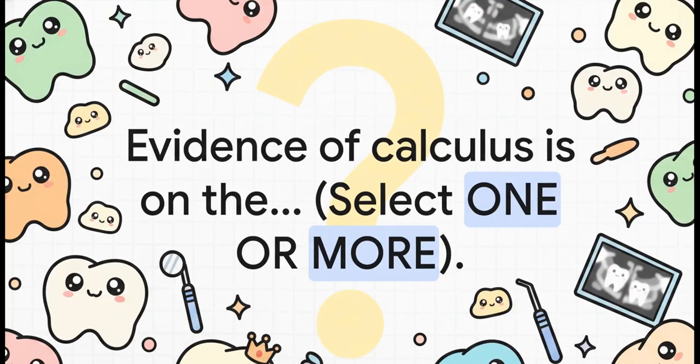So here's our big question. We're looking for signs of calculus on a few different tooth surfaces. And a little hint, more than one of these could be correct. Go ahead and scan the options, because we are about to get into the nitty-gritty of the evidence.